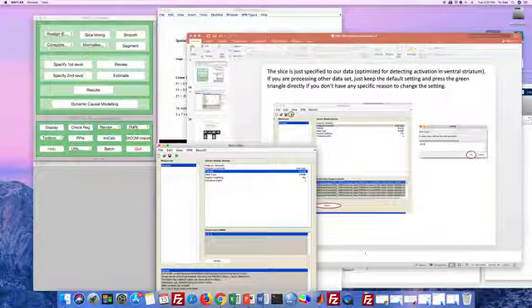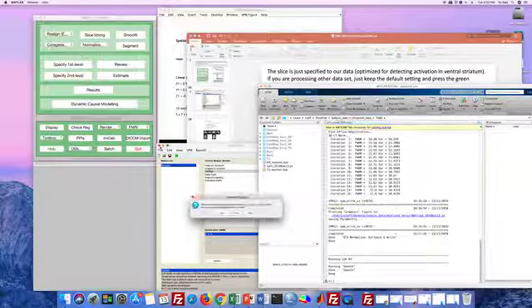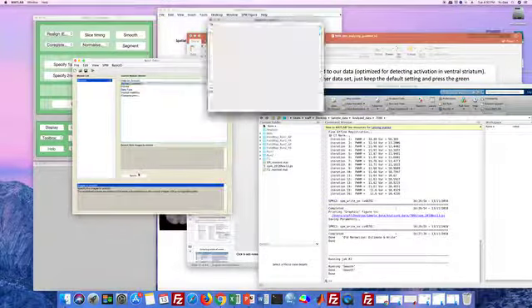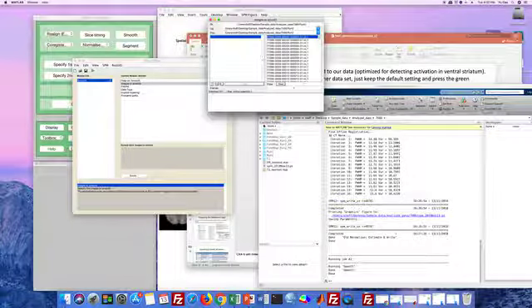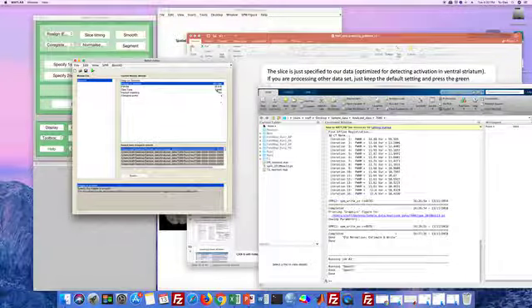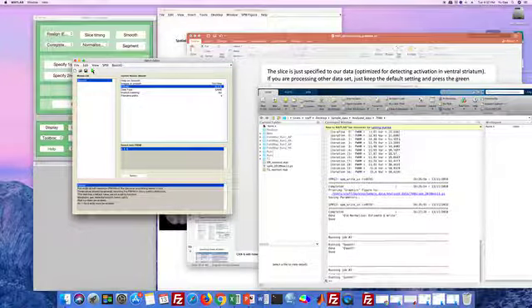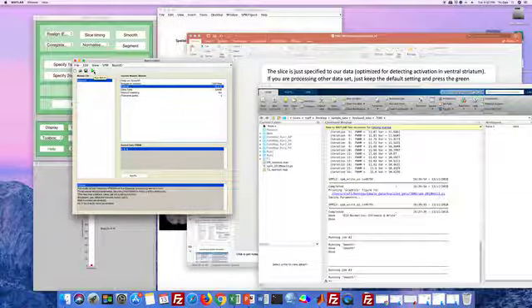Okay, it's done. Let's do it again for run 2. Images to smooth. Select images beginning with W. Select all, done. Change to 6 6 6. Press run.